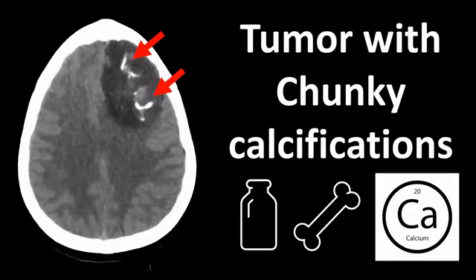Okay, let's now talk about an Aunt Minnie. There is no radiological sign associated with this tumor, but I'm showing it to you anyway, because this is one of the few primary brain tumors we can reliably diagnose on an unenhanced CT of the brain.